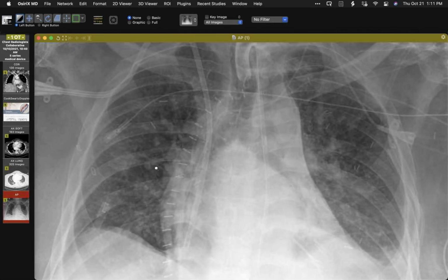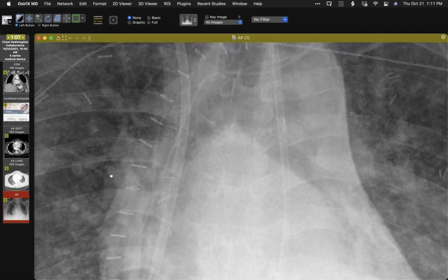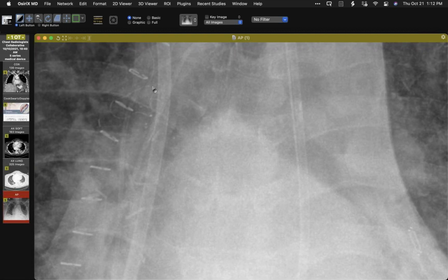But when I was looking at that, I noticed, and I was a little bit intrigued by the fact that I could tell what each device was initially, except for this thing right here. And I'll show you that that thing is associated with very small leads in this particular location right there.